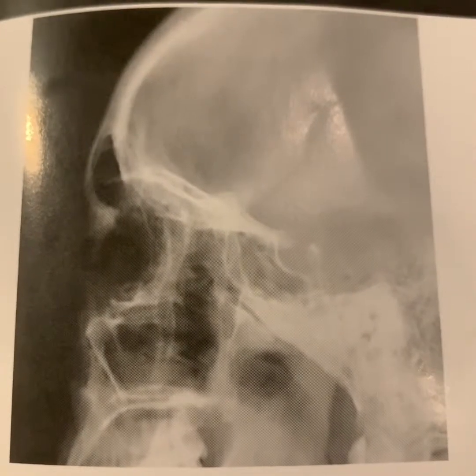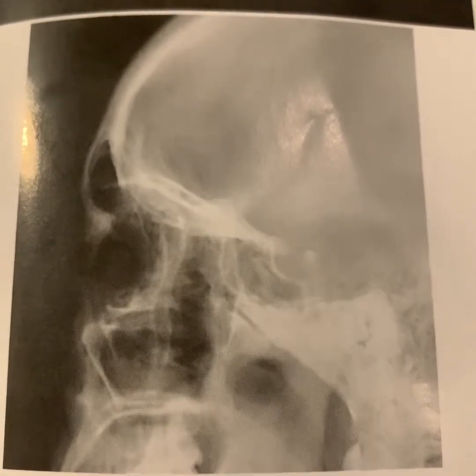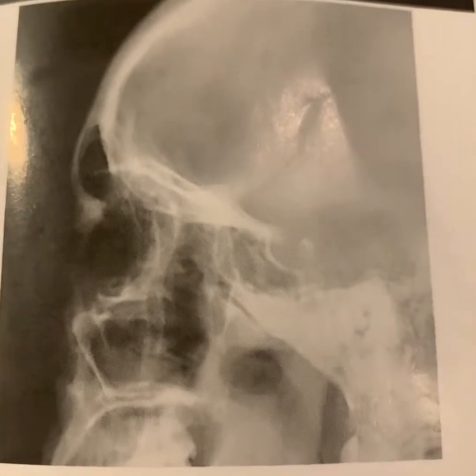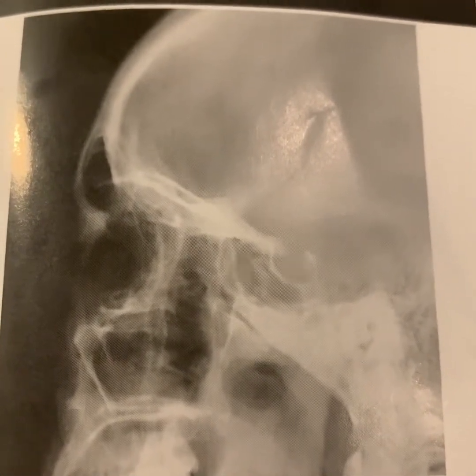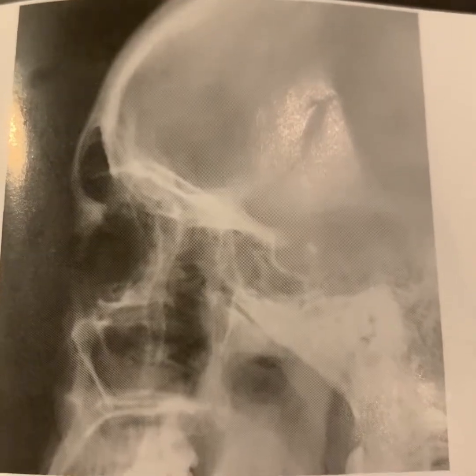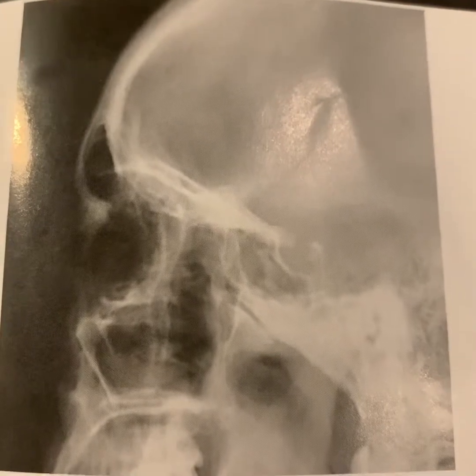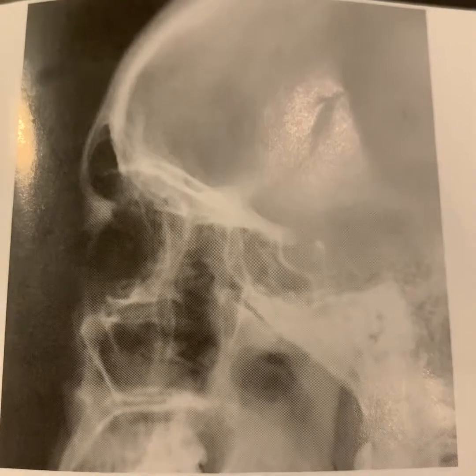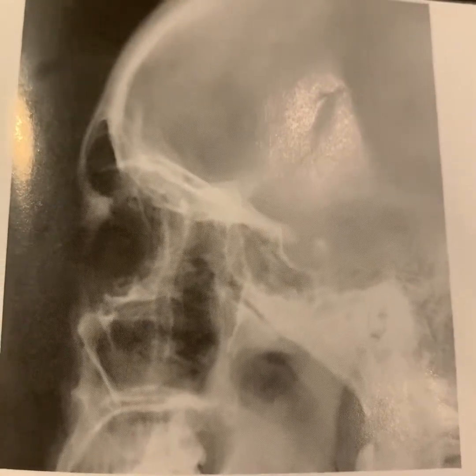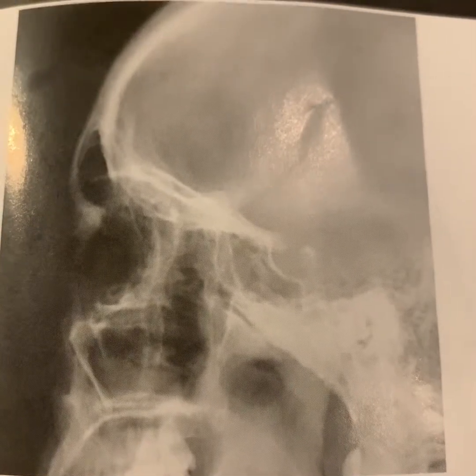Here we have the lateral image, and for this image we're able to see the paranasal sinuses. What's a good lateral? A good lateral shows a sella turcica in profile. We want to see superimposed orbital roofs. We also want to see superimposed mandibular rami, so therefore we can't have any rotation or tilt. We also want to see all four sinuses, and with this image, the sphenoid sinus is best demonstrated.